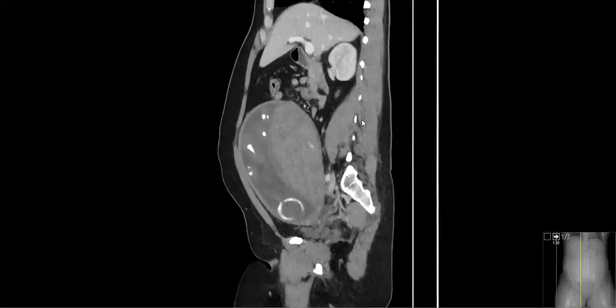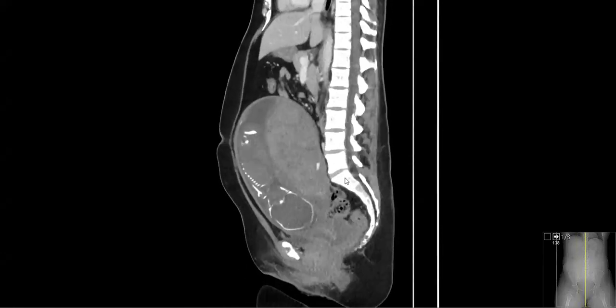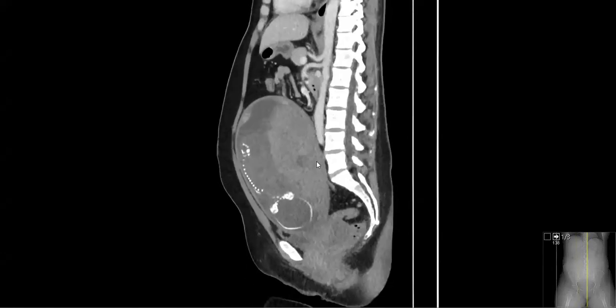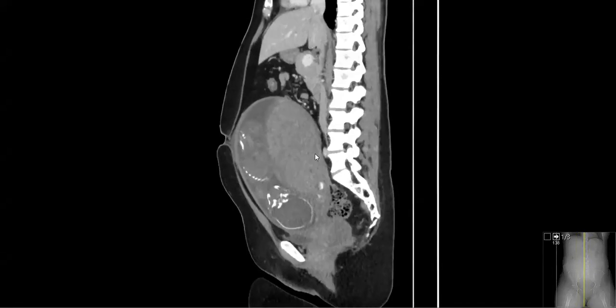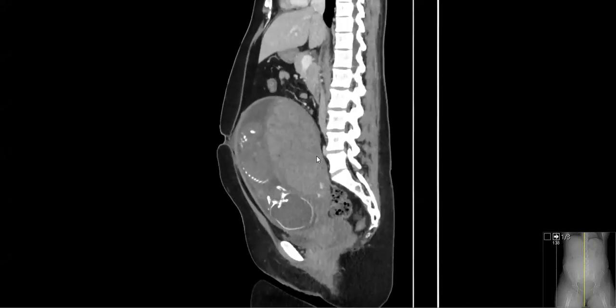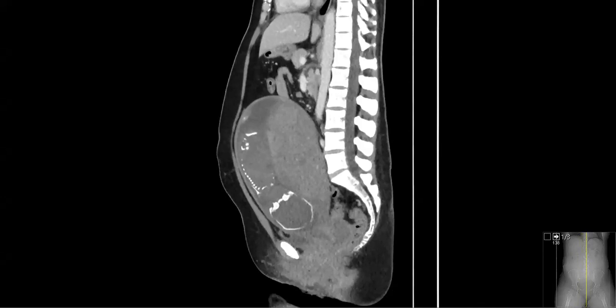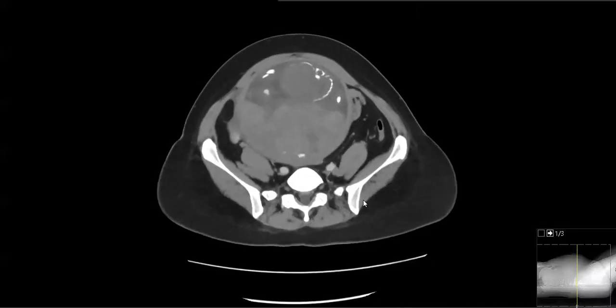This patient presented with trauma, and unfortunately, the baby did not survive. The cause of death was determined to be placental abruption, leading to loss of blood supply to the baby. We do not routinely encounter these cases, so there are a lot of learning points that can help us determine the placental abruption on a CT.